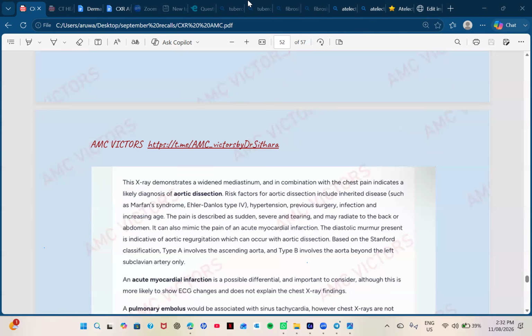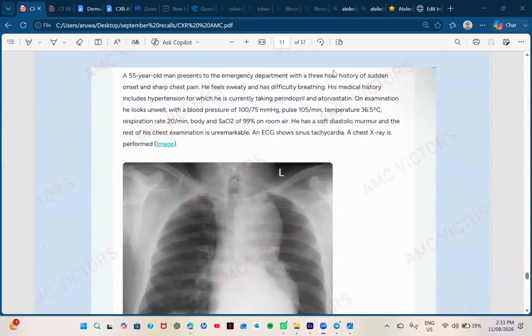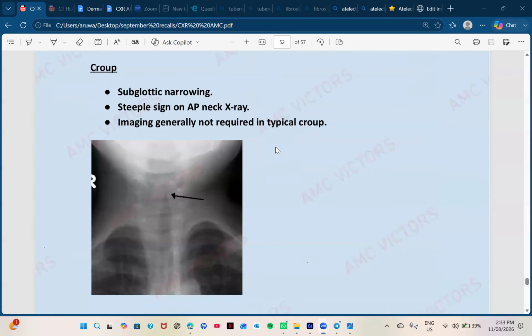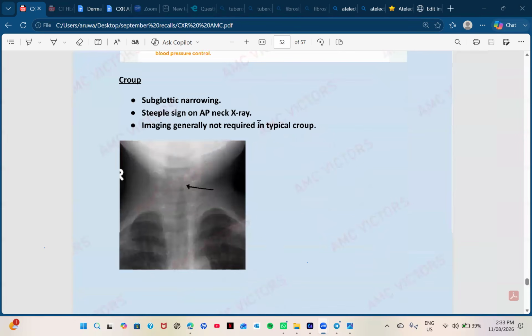What else? Yeah, those things you can see mainly. Okay, there is unfolding of the aortic knuckle, because you can't see it in here, right? Okay. Now I have attached a few other main things that they can ask about in the pediatric group, right?